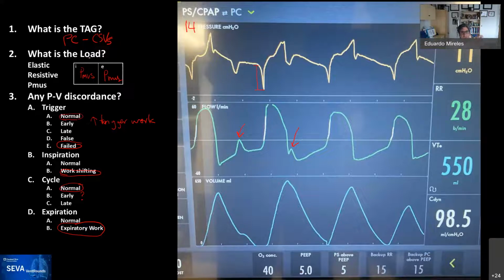You read this as this patient is doing a fair amount of activity during inspiration, and you can see how during the whole process of inspiration, the patient is active and is pulling a fair amount of tidal volume. And then during expiration, instead of having that beautiful decay, all of this is patient effort throughout the breath. So a large amount of activity going on there.